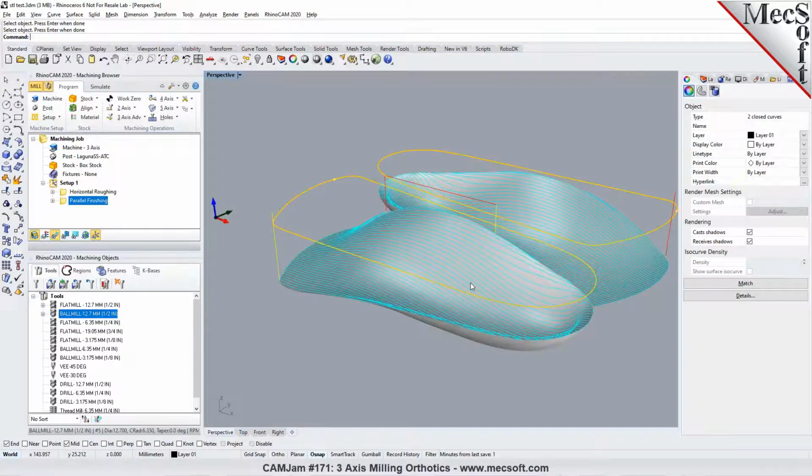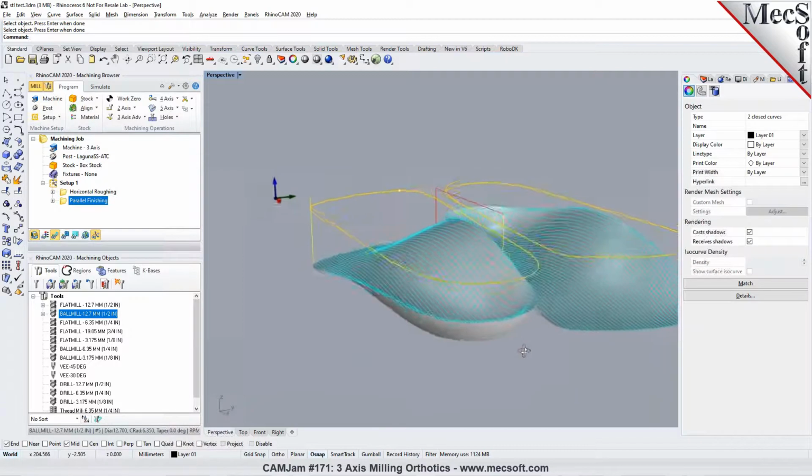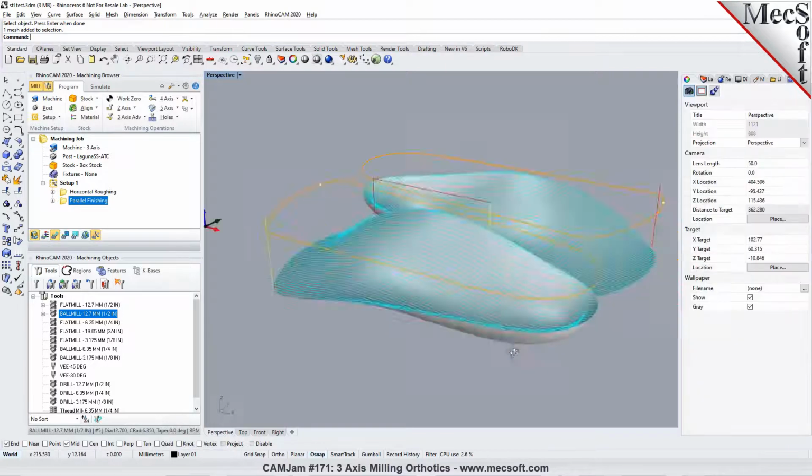Yeah. So let's say we wanted to modify this file, and make the heel area a little bit higher, a little bit deeper. Could we do it, or would that be on the design aspect of it? You want to make this deeper? You mean you wanted to bend it, or you want to modify the design?